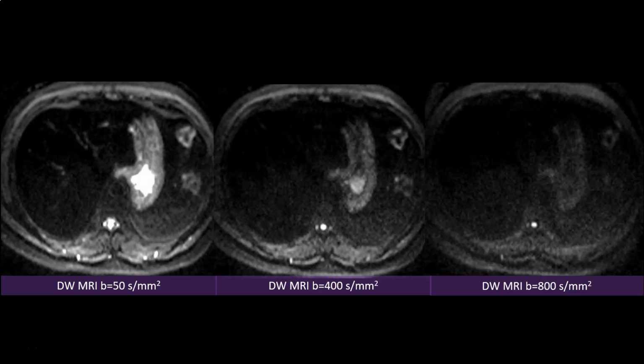If you look at the abdominal and thoracic wall, if you look at the stomach, the signal intensity is perfect. If you look at the splenic flexure of the colon, the signal intensity is good. The spinal cord is perfect. What is missing is the signal intensity of the spleen, which is usually very bright on the diffusion weighted images, and that of the liver.